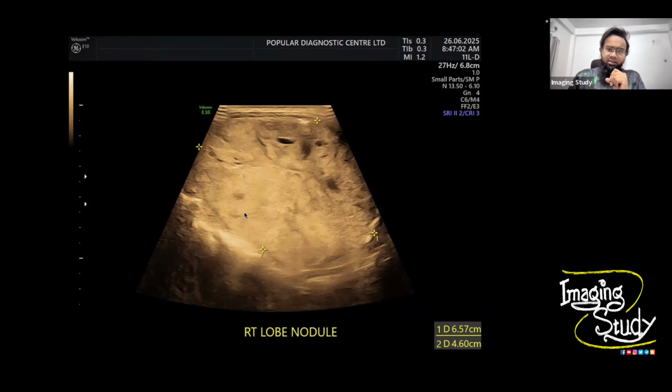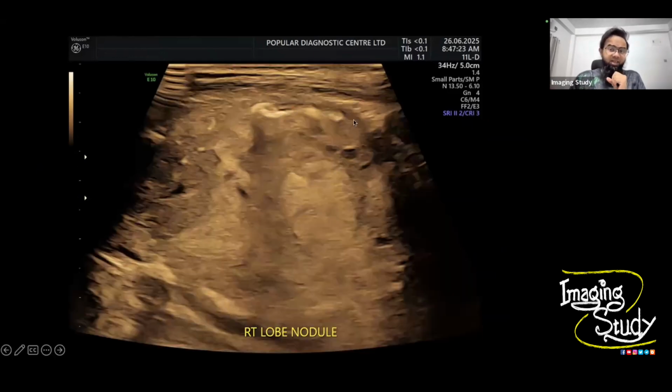Now you see this is a heterogeneous nodule, even having some cystic spaces. If you look carefully, you can see the marginal calcification is also present. Marginal calcification takes marks in the TIRADS scoring, so you have to describe that. And there are some tiny calcific foci here also, which is another notorious finding. This is almost an isoechoic to hyperechoic nodule, and it's a solid one.